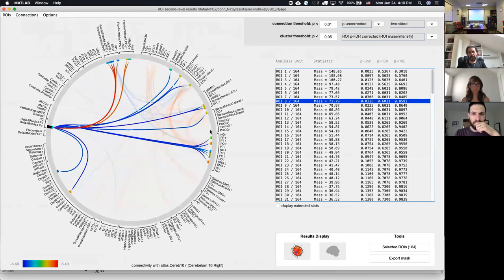When it gives you the significance of the results, it tells you the significance of this group of connections, where they are strongest. It doesn't care about the sign of those connections. It's like an F-test, where you're looking at whether the sum of all those statistics is significant. In this case, it's considering all of these super-threshold connections, and computing the mass across all of them.